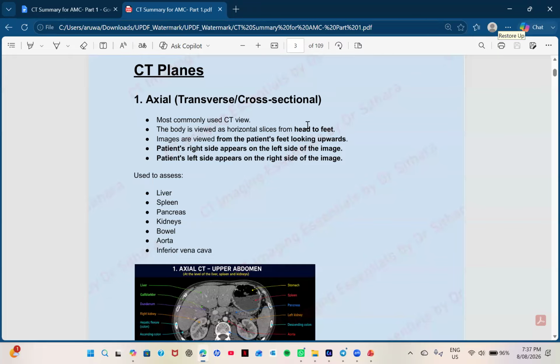In that case, you can see the arteries enhanced very brightly. So we usually use the arterial phase to understand vascular pathology, right? If there's active bleeding ongoing or some leaking happening, in those cases we use the arterial phase. That is not that important, just listen, okay? It's important mainly for the radiologists, not for us.